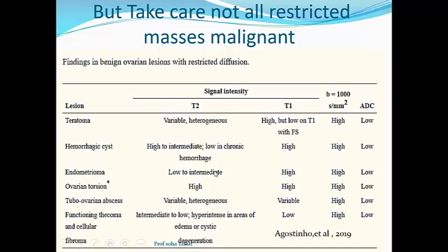Endometrioma shows different signal intensity. We have seen cases of endometriomas previously in the lecture. Most cases show restricted diffusion. It's high and low, showing restricted diffusion.